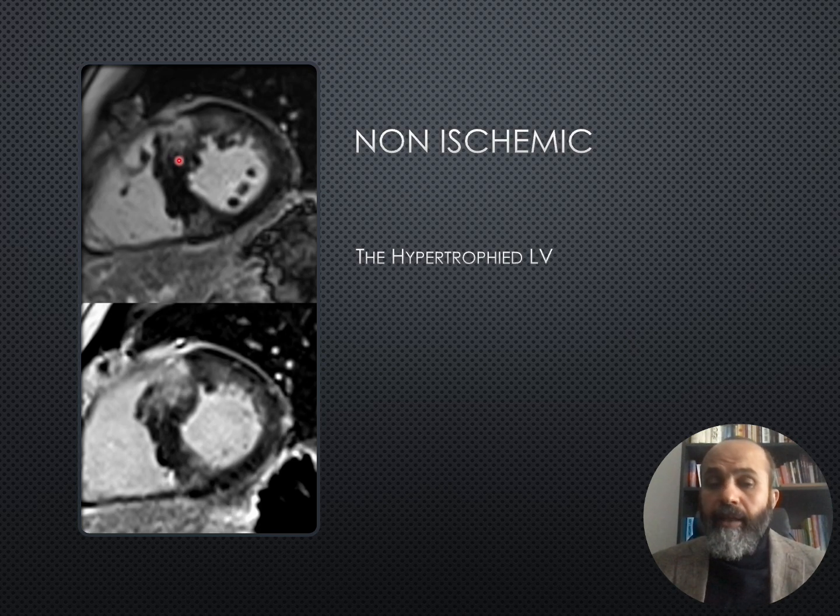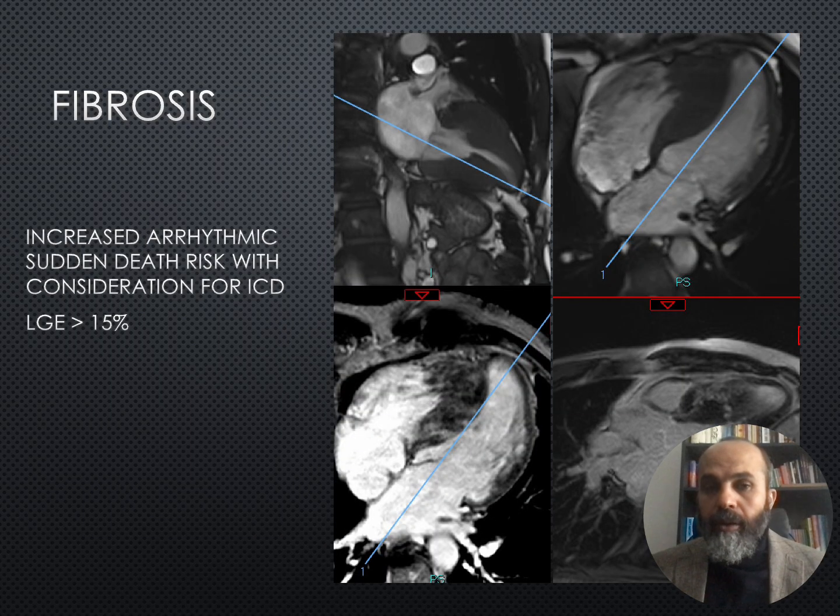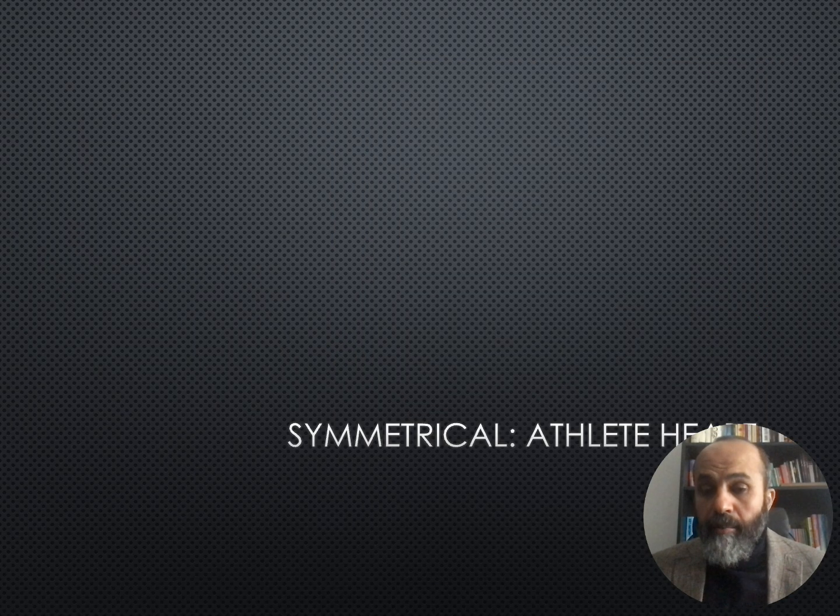Non-ischemic also in the HCM, we know that the late gadolinium will be in the hypertrophied segments, non-ischemic form, so it's not subendocardial, it's in the midwall in those areas. And please try to measure the burden, because that is going beyond the diagnosis. That is risk stratifying patients. We saw many professional players that died on the pitch because of HCM. If the burden is above 15%, they are indicated and justified to have an ICD implanted.